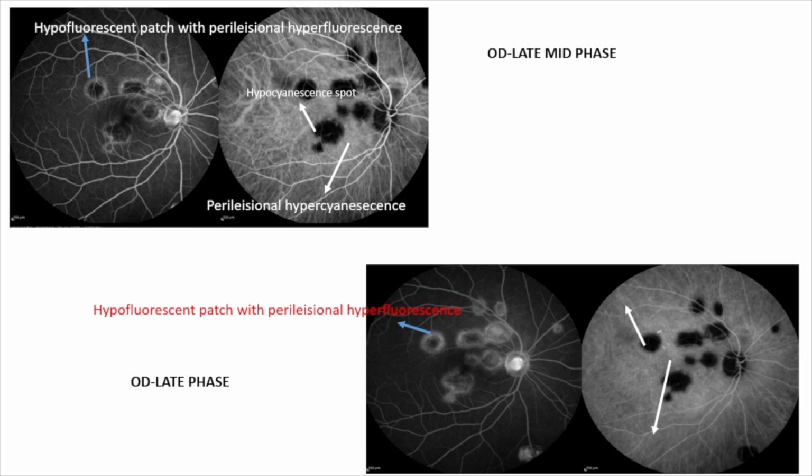Yes. ICG actually tells you the true size of the lesion, whereas the FFA will just tell you the central area is more involved because it's damaged. Either the choriocapillaris is ischemic or the overlying RPE is edematous, so you can't see the choriocapillaris. FFA shows choriocapillaris activity covered by the RPE. So if the RPE is healthy or hyper, you might not see the choriocapillaris very well.